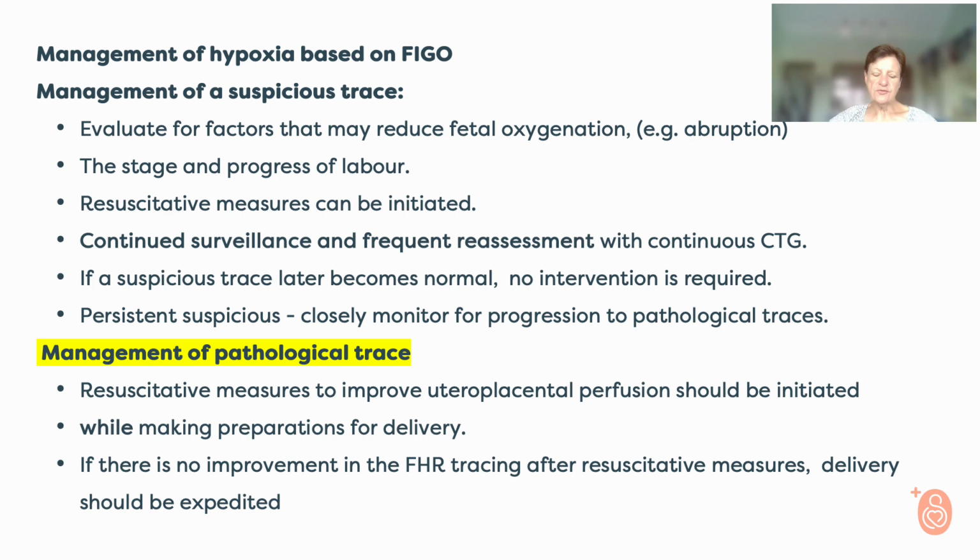And we have talked on the previous slides all about the management of the pathological trace. According to the FIGO guidelines, we have said that it's pathological and we need to resuscitate. And if the fetal heart rate tracing is not improving, then obviously labor should be expedited.